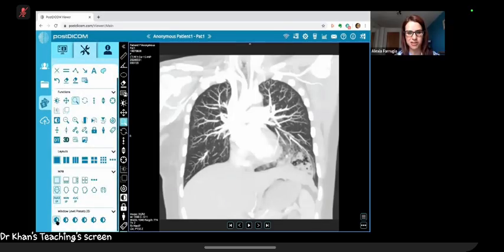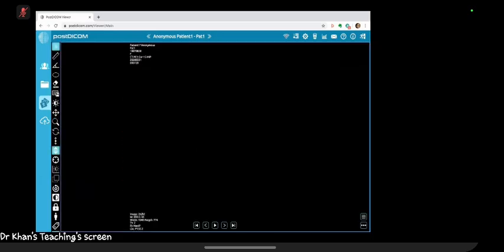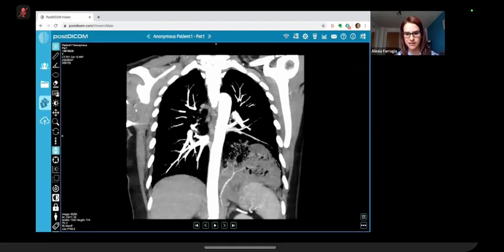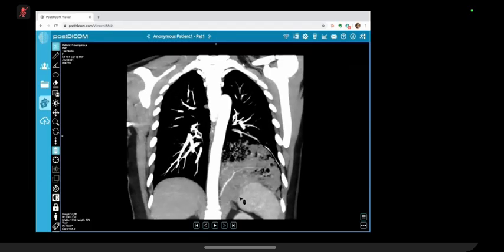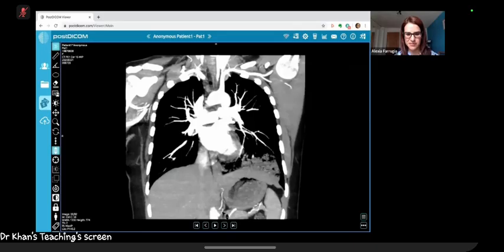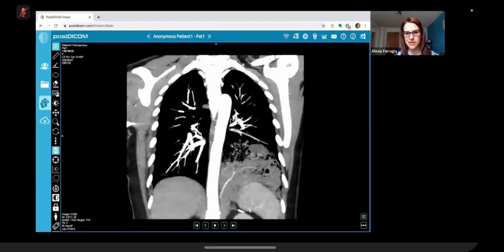Intralobar, sorry. The more common one, isn't it? Yeah. Okay, great. Look at that. Oh, that's beautiful. So it's arising from the celiac trunk there, and supplying this area of lung.